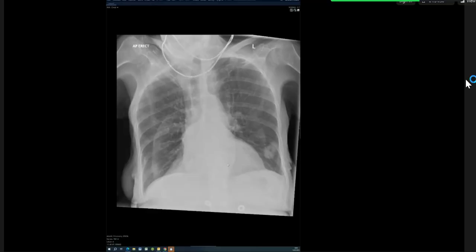So, for example, if it's on your reporting file, you pick it. If you miss it, it is an unacceptable miss. Yeah, even without the nodule in the left lower lobe, you have to pick that cancer. And unfortunately, lung cancer is the one cancer that we will all miss more than once in our reporting life, and it will be on a chest X-ray. Incidental lung cancers are picked way more than cancers from 2-week wait pathways because of how much there is and how late they present.